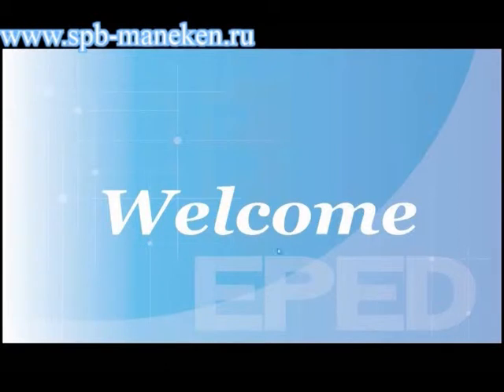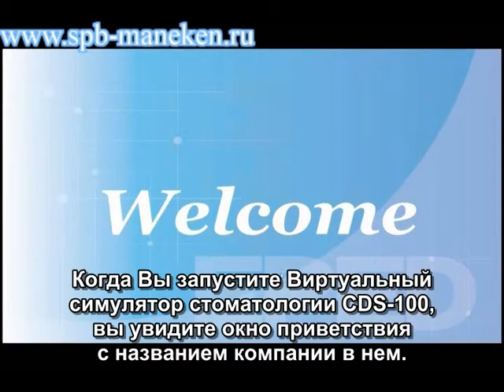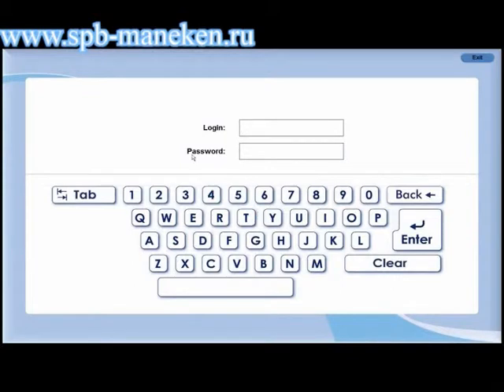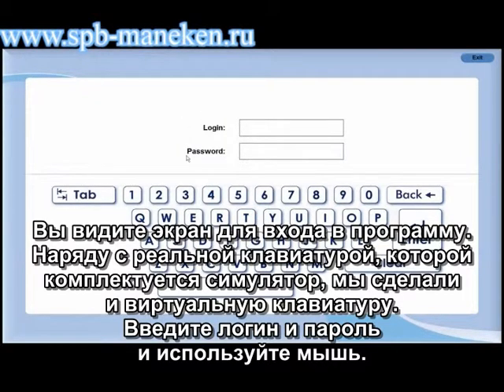When you get started with the CDS-100 dental training system, a welcome sign and the company's name will be shown on the opening screen. You may click anywhere on the screen to proceed to the next step. Here is the login screen.